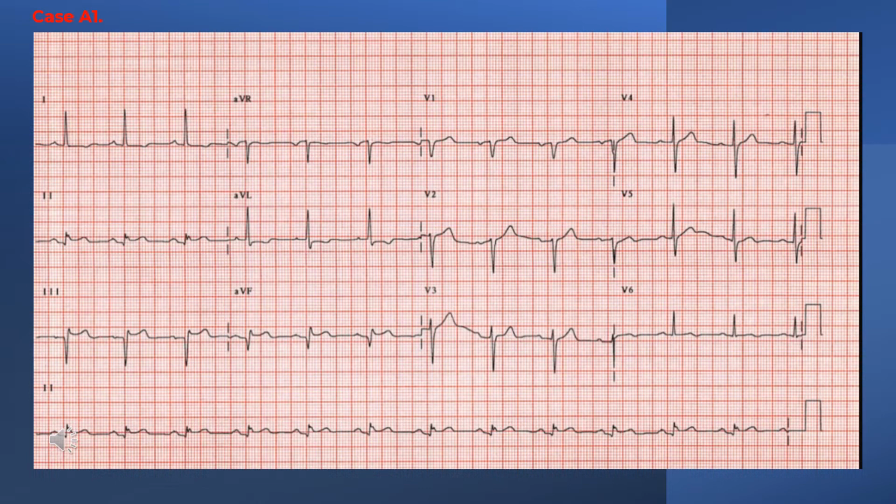The T wave is flat in V6. Comments. The ECG shows recent inferior infarction. In addition, the changes in the lateral leads are compatible with lateral ischemia.